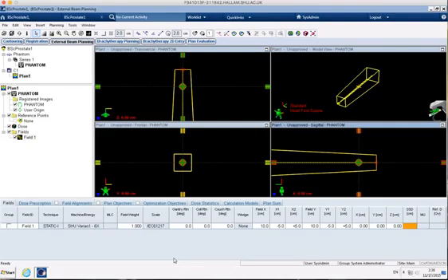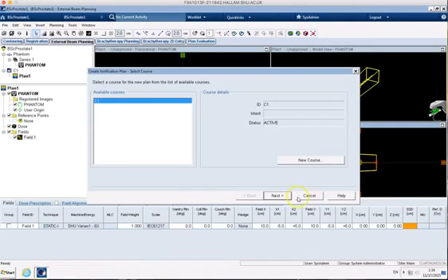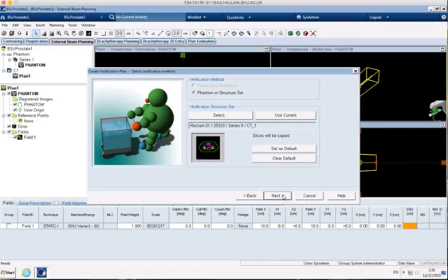And there isn't a straightforward way to do this in Eclipse, so this is a little bit of a workaround on how to do that. The way we're going to do that is to go to Planning, and we're going to create what's called a verification plan. So create verification plan. And then next. And then we're going to select the patient we're going to use.